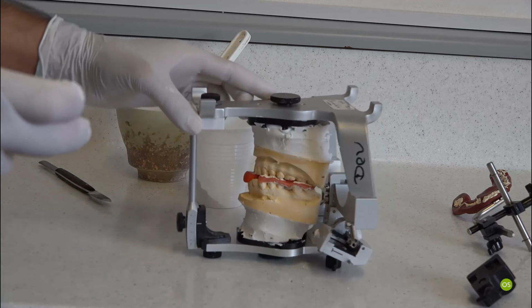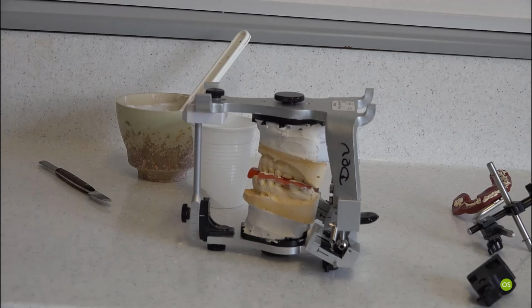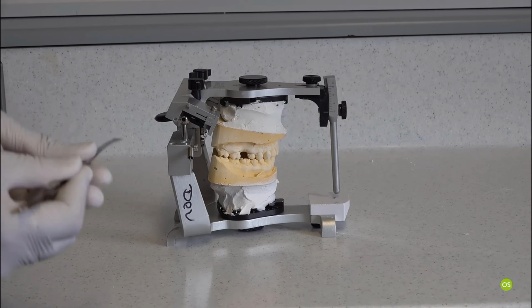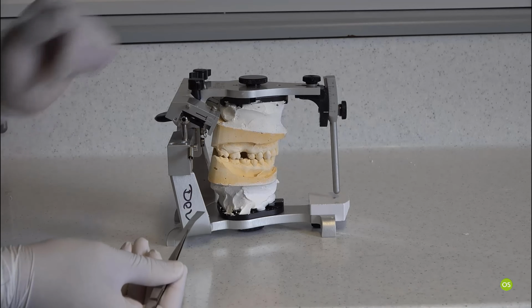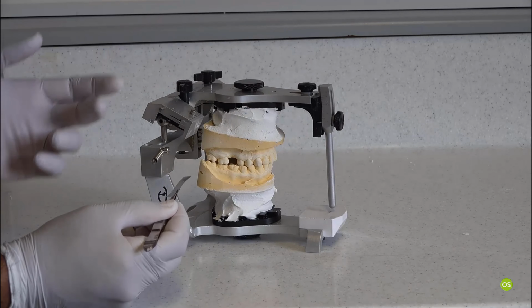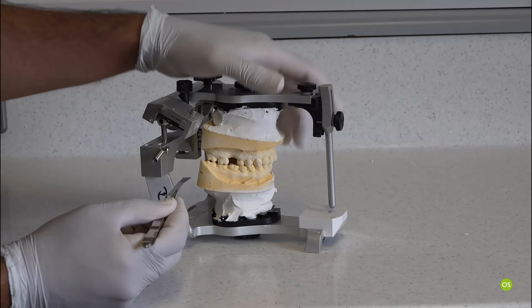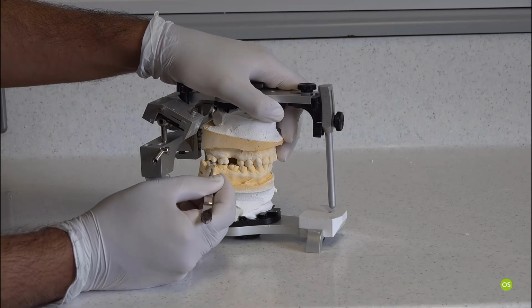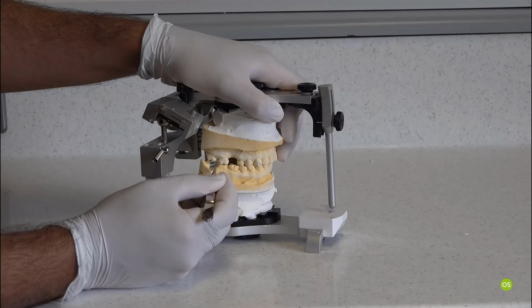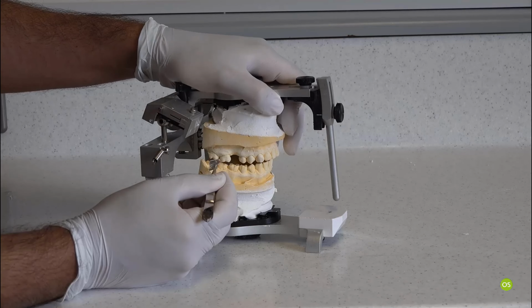Okay, now we'll just wait for this to set properly. Now we're going to assess the mounting, and let's have a look whether the tooth we decided during the clinical examination, which was lower right 8, upper right 8, which was in contact with the first, and you can see that it's really, I'm pulling hard and it's not budging, so that means that's the contact and model has verified.